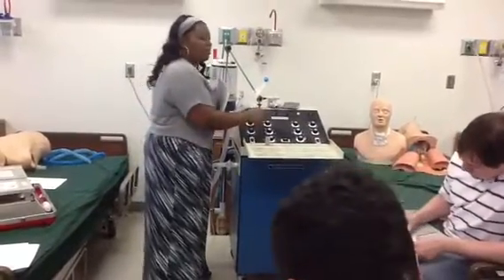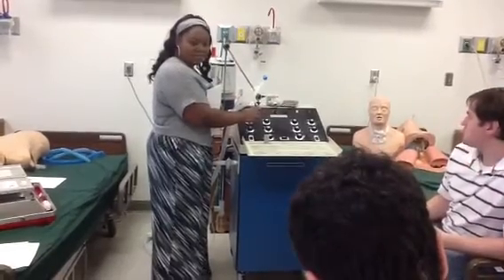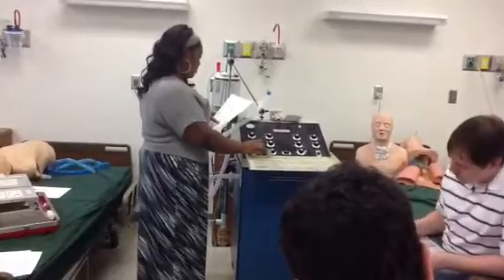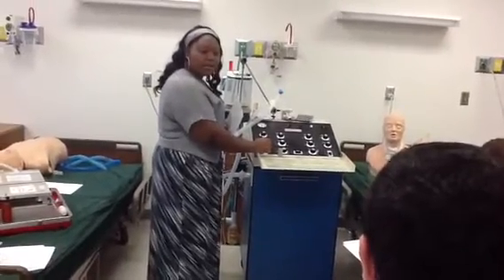Above that is your normal pressure limit. It's an alarm. So that's F. It goes off when the pressure is too high.